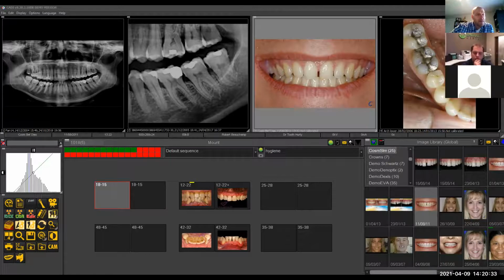Let me just see if the manual would have something. Again, I'm assuming there's a text manual that I'll have access to, and I can just read the documentation. Yeah, I'll just have to look and see if we can still access that small library that we had. And the 3D viewer is an additional option that they have to purchase.